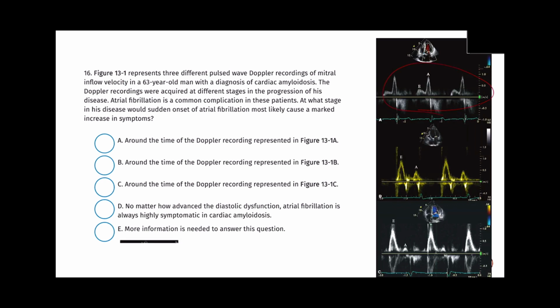This one? Yeah. Why do we think A? Talk me through it. He's very, very reliant on his atrial kick. Good. Yes, that's exactly the reasoning here. So in patients who have early diastolic dysfunction, they develop rapid AFib and they have an immediate drop in their hemodynamics.